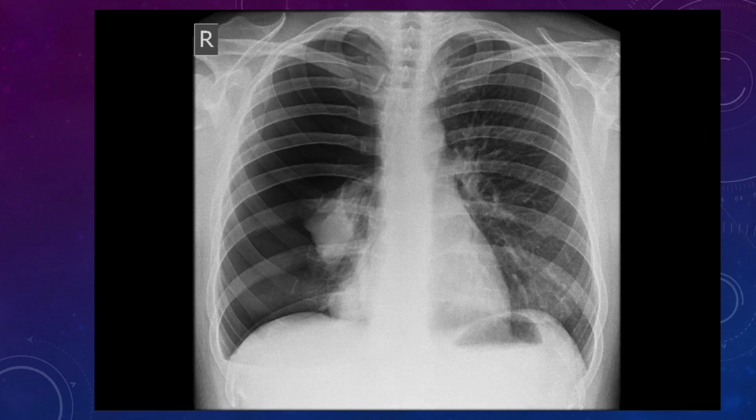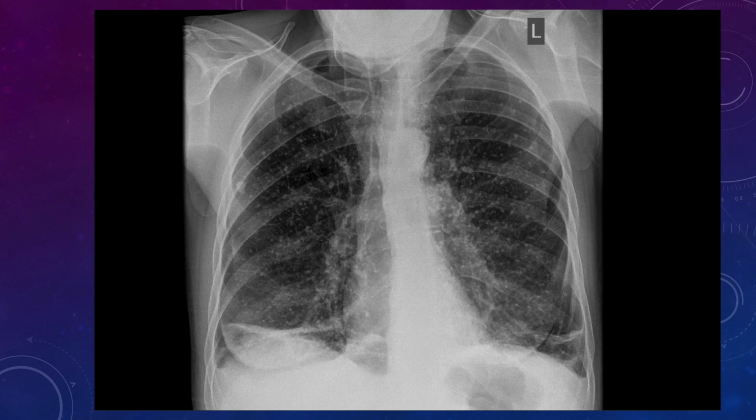Okay, and then an even larger one. The lung will always go down to the mediastinum. Okay, and it collapses down like a balloon to where it's tethered at this point here. Okay, complete, and we're starting to push right heart borders almost at the level of the lateral side of spine. So the heart is slowly being pushed over due to the pressure within the thoracic cavity on the right. Okay, another one.